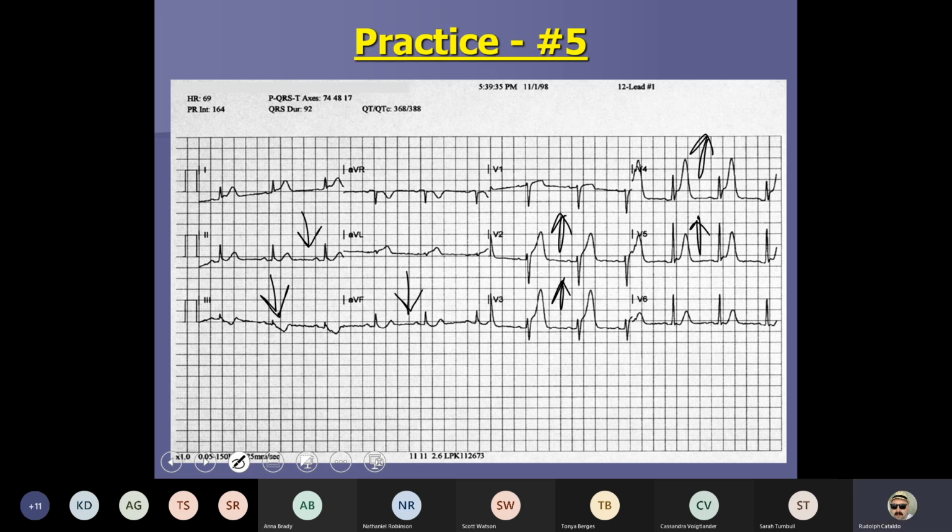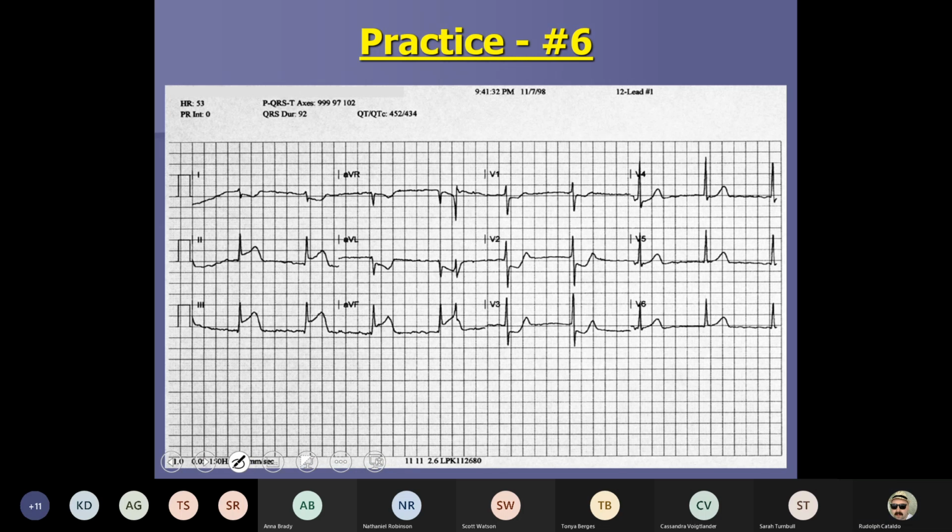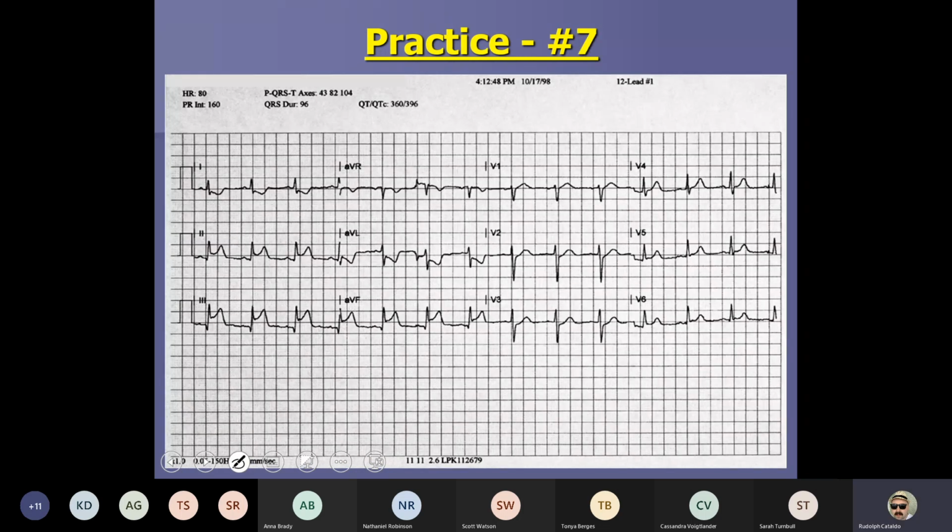Yep. It looks like the ischemia is gonna be on the right side of her heart or the inferior. Okay. And because then ischemia is depression, right? Yes. Okay. Then the injury is going to be on the left side and anterior. I'd agree with that. Good job. And we've done the inferior. We've done that.